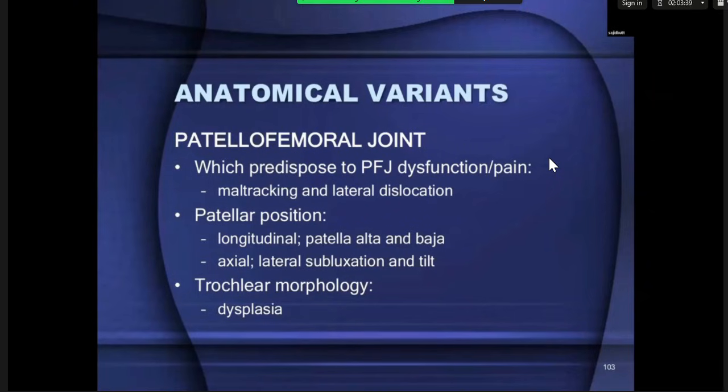The patellofemoral joint can be subject to mechanical pain because of the maltracking of the patella. What does maltracking mean? Maltracking means that once the patient bends their knee, their patella tends to go laterally. Once it goes laterally, it can catch a bit of Hoffa's fat pad between the patella and the lateral surface of the femur, the trochlear surface. And this results in the fat getting impinged and the patient presenting with anterior knee pain.